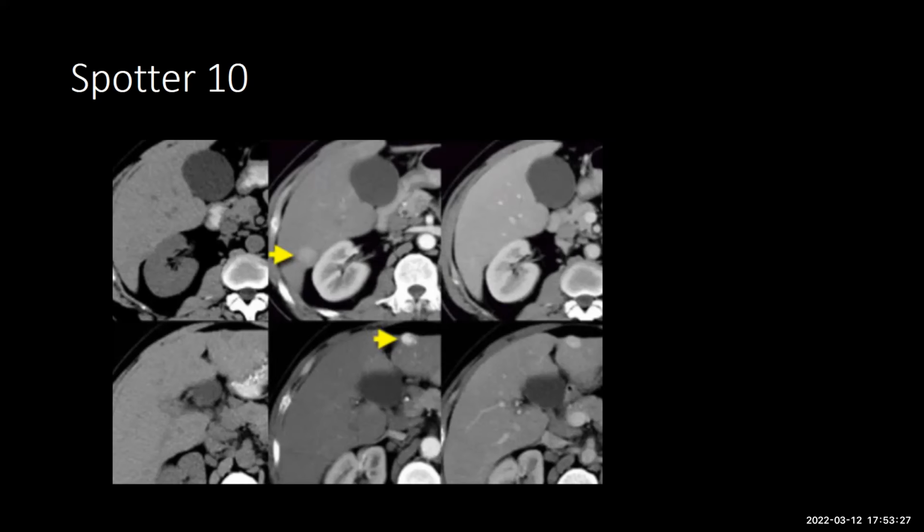Washout. So what is washout? Definition of washout: when compared to the adjacent liver parenchyma, if the lesion is appearing hypo, the lesion is losing contrast in venous, portal venous and delayed phases. So remember that a lesion that is enhancing becomes less dense than the rest of the liver. That you say that it is doing washout.